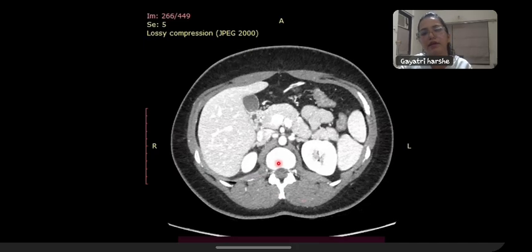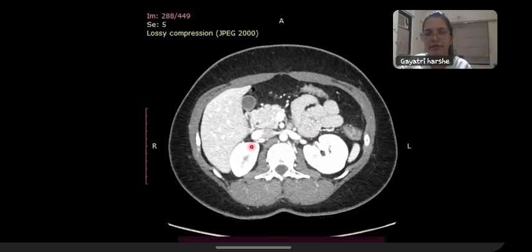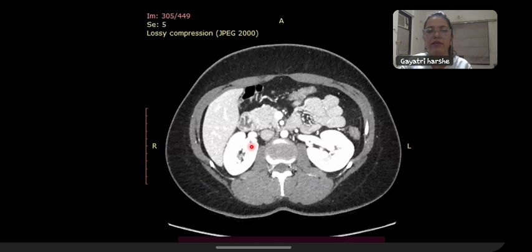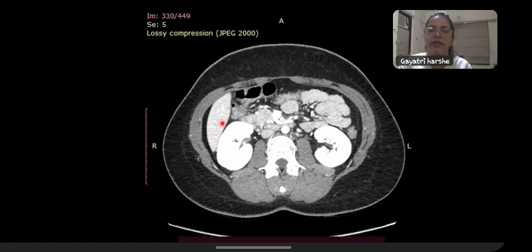This is the right kidney, which is adjoining segment 6. So that is another landmark which we can use on ultrasound for identification of the segment. So up to inferiorly, this is segment 6, which is draining this segmental area.